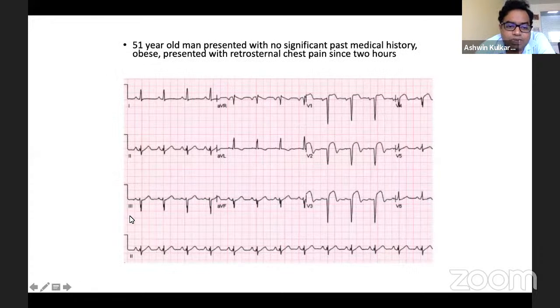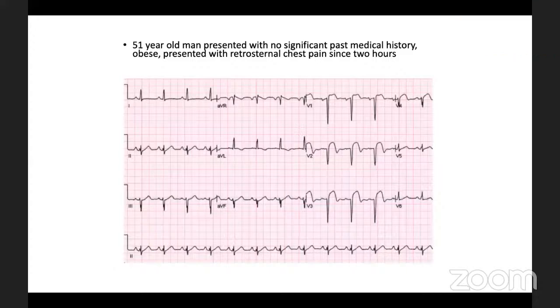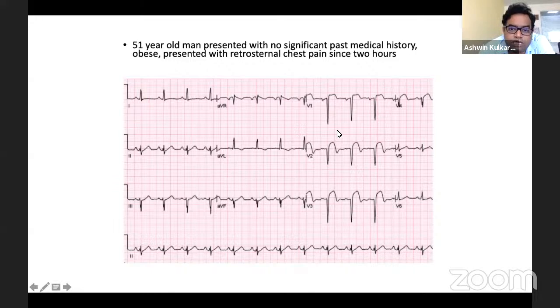So this ECG, Vijay Balaji, can you attempt? Yes, sir. This ECG is showing biphasic ST elevations in the anterior leads with some biphasic T waves in V2 to V3, with ST depressions in AVL. There are no reciprocal changes in the inferior leads. Okay. So generally this depicts an anteroseptal MI, where there is involvement of V1 to V3.